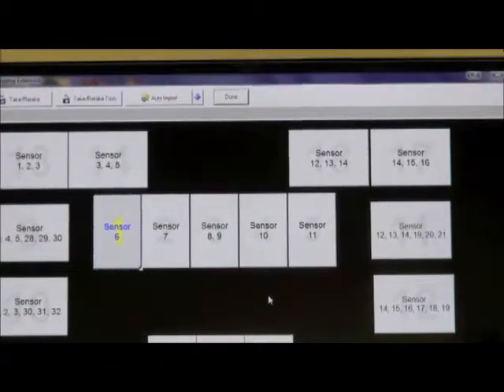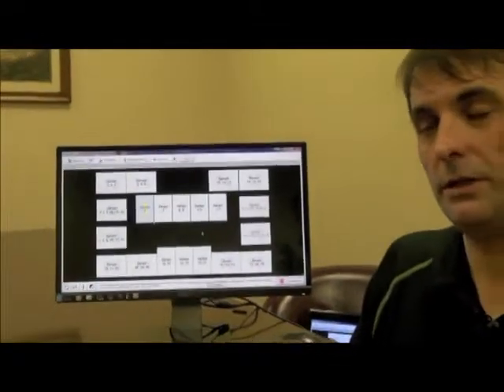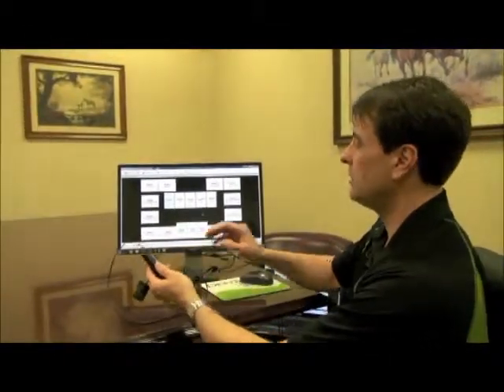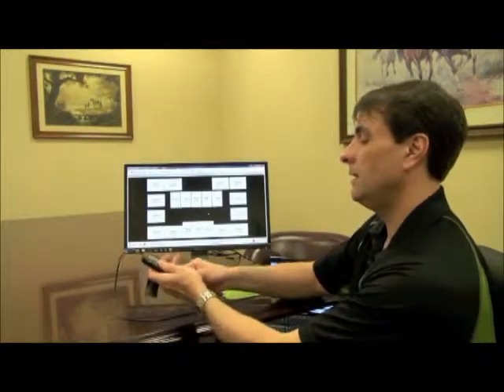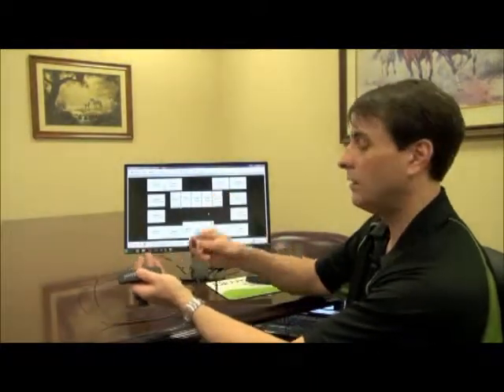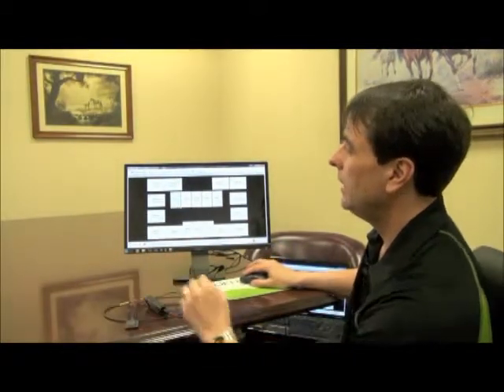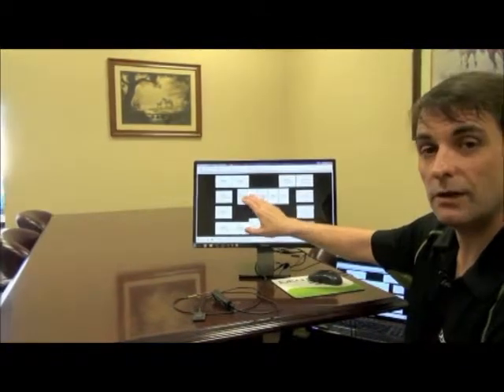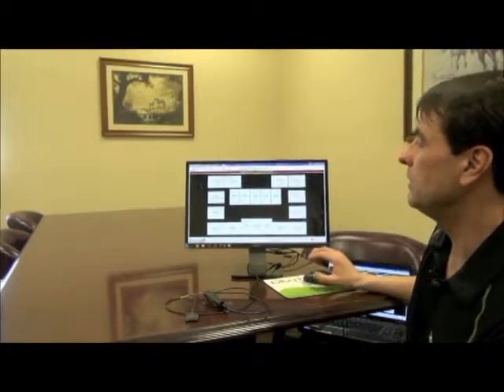There. Now it's also important to note if you want to change sensors in the middle of a series and, let's say, unplug the number 2 sensor, you always need to click stop series capture and quit. And then you would unplug your sensor, plug in your new sensor, make sure the tile is highlighted that you want to start on in the series, and then simply click Capture Series.